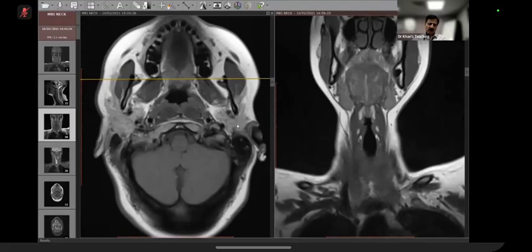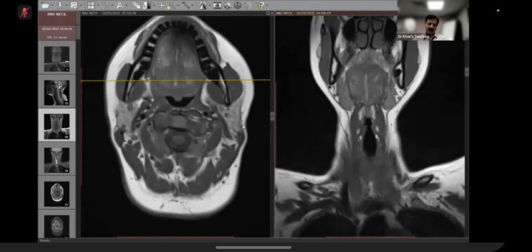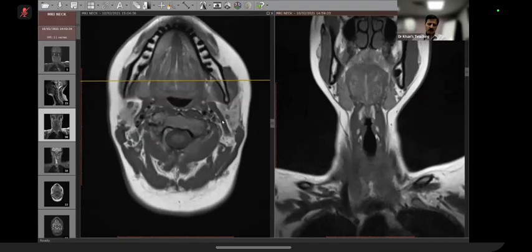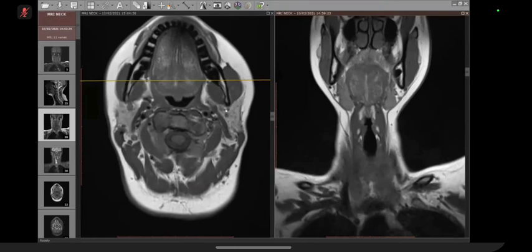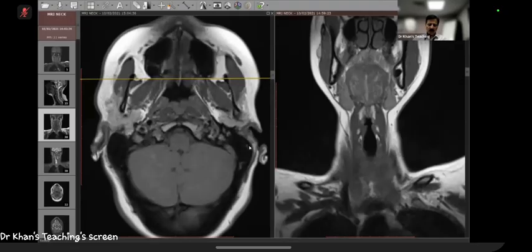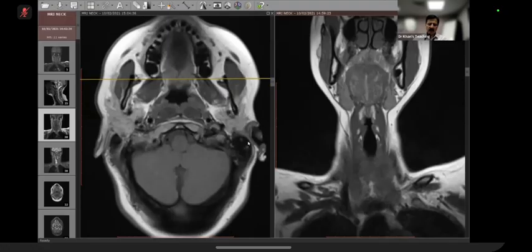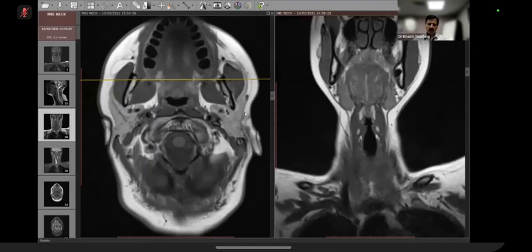One thing in anatomy which I want to repeat right now is that this is the parotid gland. Candidate 1, there is a muscle here. What is this muscle? Oh, sternocleidomastoid muscle. No, you see this is temporalis. So let me orient you and then you will tell me. So if you see here, this is the mastoid process. You know, there is no signal here. Now this is the parotid gland. This is the deep lobe. This is the superficial lobe.